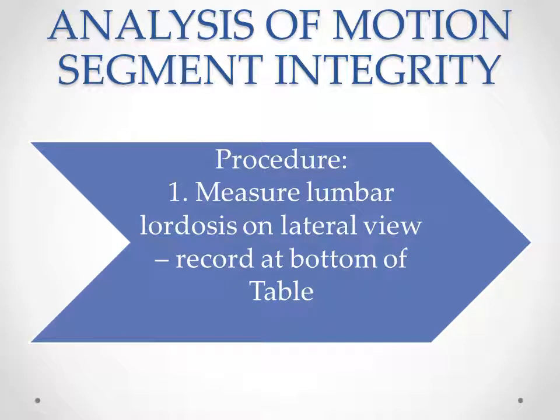Okay, so to begin with an analysis of a lumbar spine motion segment integrity, begin with your neutral lateral lumbar projection. And begin by measuring the lumbar lordosis.